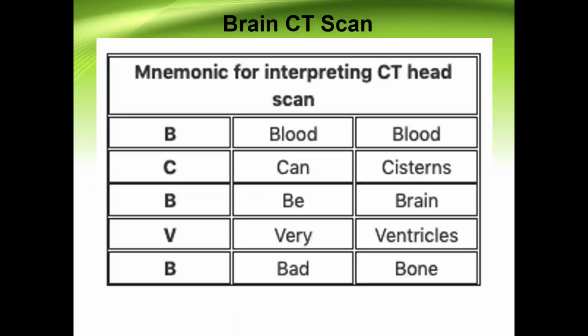All right, so this is a normal brain CT. Now, in interpreting a brain CT scan, people use different ways. You can use the ABCD approach, all right? But I prefer this one because I'm not a neurologist, I'm not a radiologist. I just want to be able to identify some lesions in my patient. So I like this one.